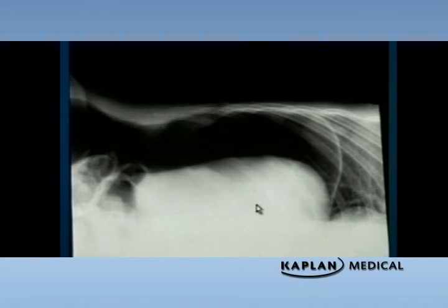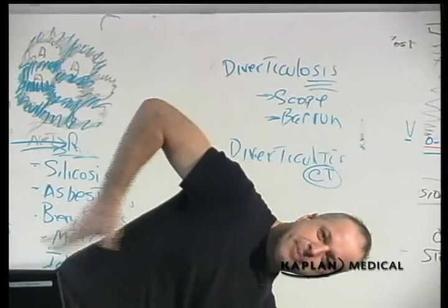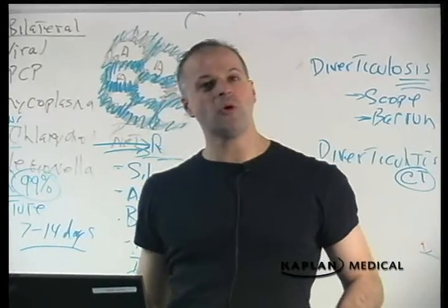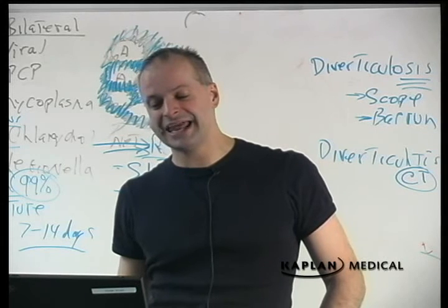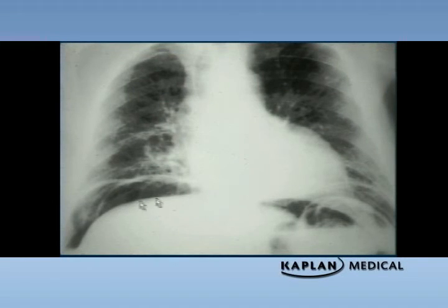This is a person who is lying on their side and the air is building up here underneath the diaphragm. It's just a person who's showing more air under the diaphragm for a person who's too sick to get up. Bowel wall and intestines, liver, air, diaphragm, and up here is the chest. There's a little pulmonary vasculature. Cross-table lateral. How do you look for air under the diaphragm when the person can't sit up for the upright chest film?